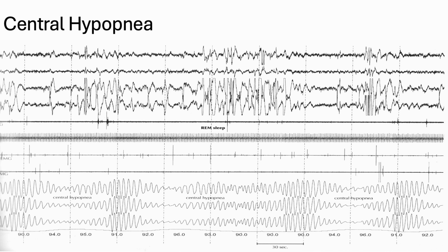Here are good examples of central hypopneas. These appear to be occurring in REM. Usually we expect some central activity in phasic REM. However, this looks pretty rough because these are some pretty tough desaturations. That's 4%. But, and I probably score these because oxygen desaturations in REM have been known to cause headaches, and you're just not supposed to desaturate like that.